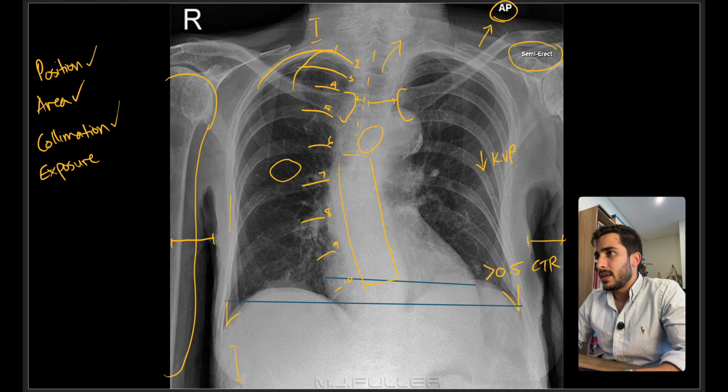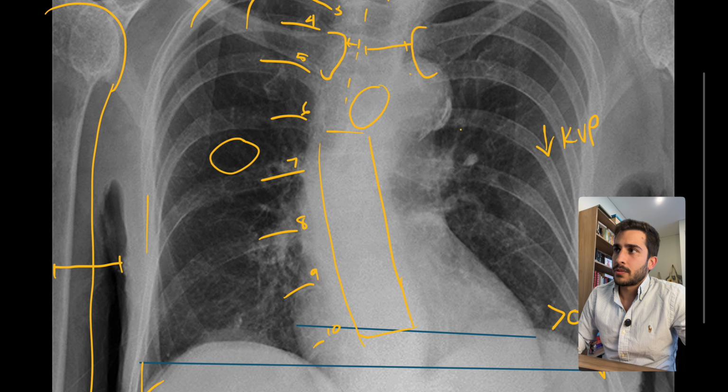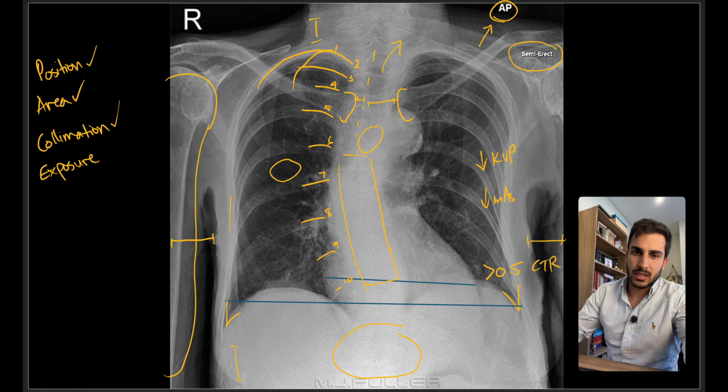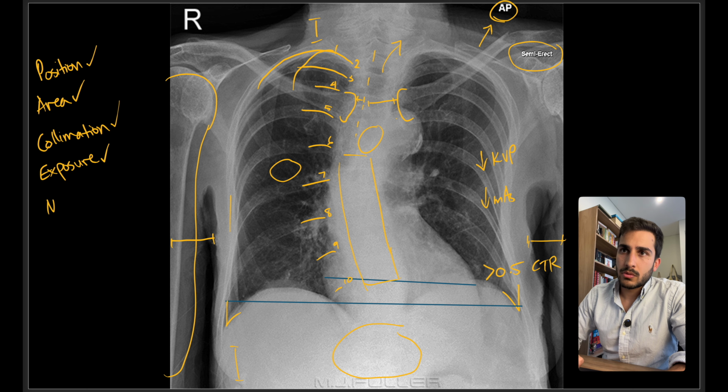Now this may be just a poor quality image from the internet, but if I zoom into the lungs itself, okay, it seems a bit grainy. So I would say probably low mAs on this one. Both of them would need to be slightly increased for this to look quite nice. And definitely there's a lot of quantum mottle down in this abdomen area, which is expected, but that's what you see there. Okay, so that's exposure. The next one is marker.